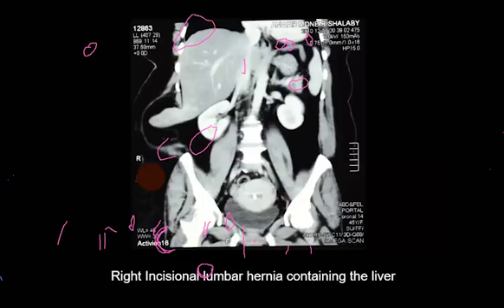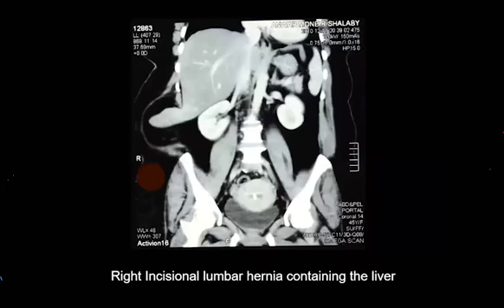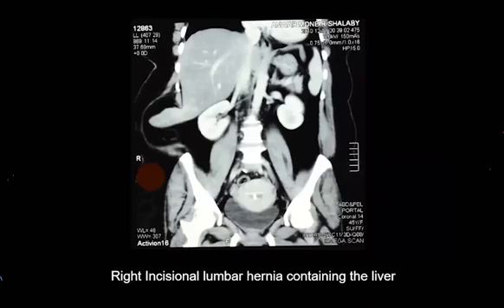You don't usually get a CT for a hernia, but this is really enlarged. The film that was really enlarged. Zoomed. اهو. يلا.